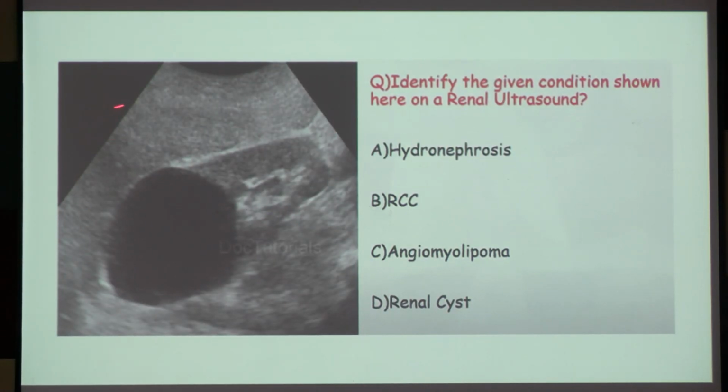We are going one by one. Liver we have seen, this is more black than this. There is a white structure out there. So this is a normal kidney in its one pole. Lower or upper doesn't matter. One of the poles is normal. The other we can find is a large black shadow. Okay? So basically this can be either a hydronephrosis or a renal cyst.